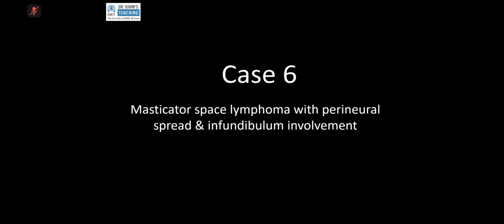Another thing is, don't use the word infratemporal fossa. These are old terminologies. You have to use new terminologies. And this is what we call the masticator space. You were using the word pterygoids, which was fine. And please remember that this is masticator space.